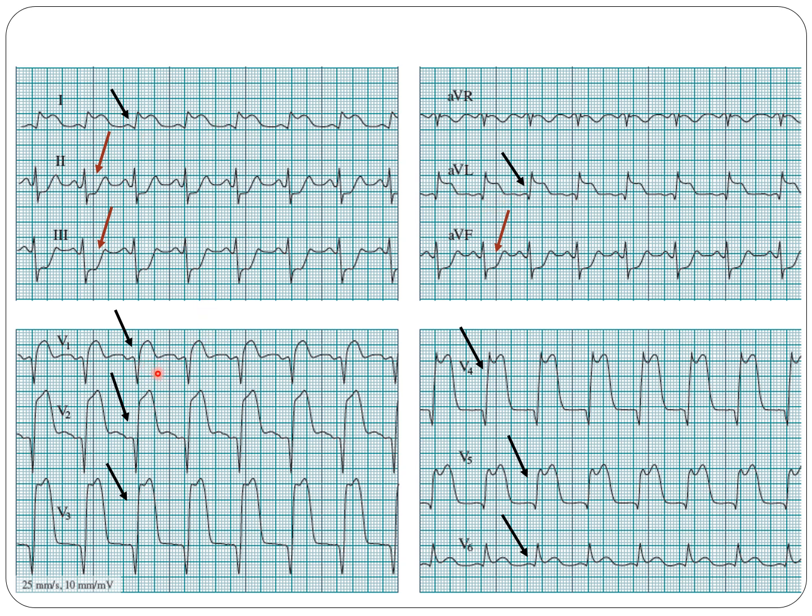And very similarly in V1, V2, V3, V4, V5, V6, pathological Q wave with ST elevation. So that's again an acute, extensive, anterior MI. And again, the red arrow dotted the mirror image or reciprocal changes due to the high lateral MI.